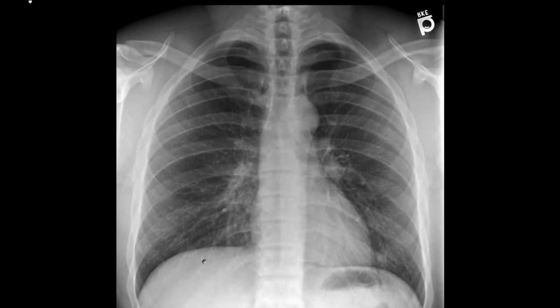And as you look at that, I'll give you the context. This is a football player, and he went to our orthopedic hospital after he was tackled on the field, or at least involved in a tackle. He was crunched and subsequently developed chest pain. But that is the context. It was a football injury.